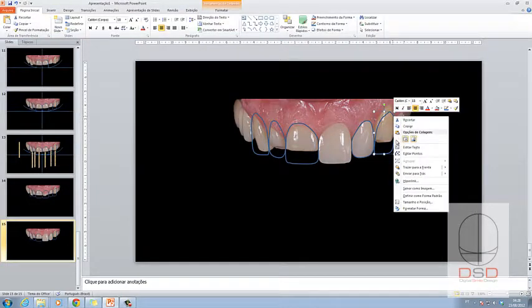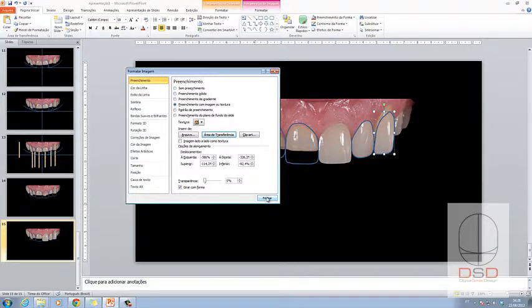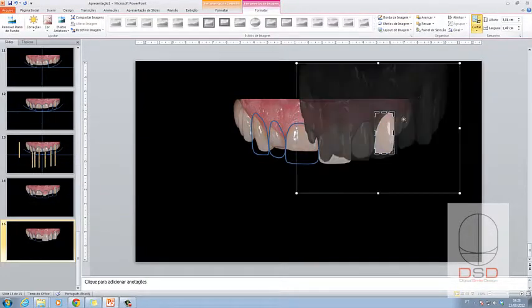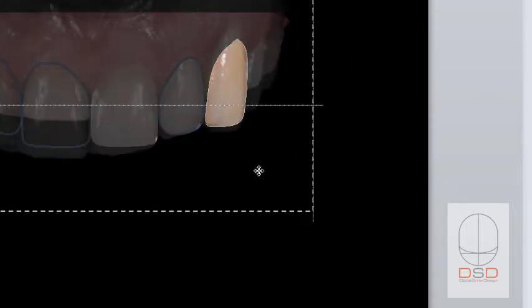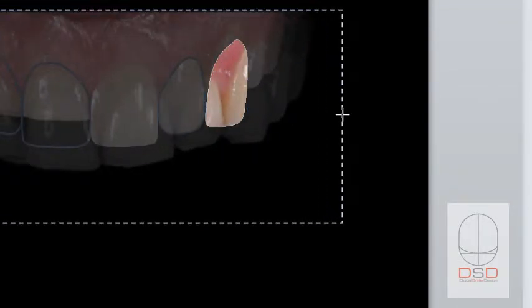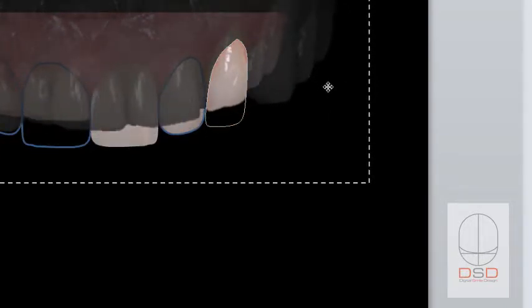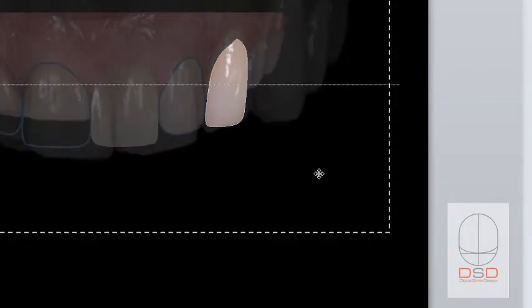Let's do the same for these teeth. Transfer area. Now clicking it here, go to crop, and then just reposition. Now I need it wider and shorter. You can choose. I'm still going to keep the texture of the canine, but I could use the texture of the lateral. It doesn't matter. I just make the lateral bigger, and I think I'm happy with this lateral.